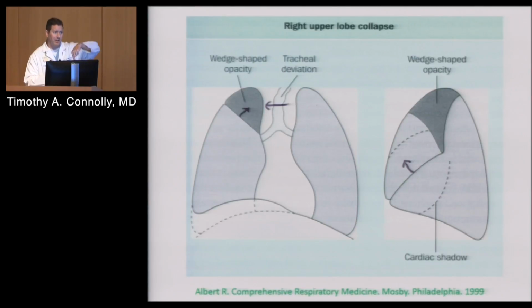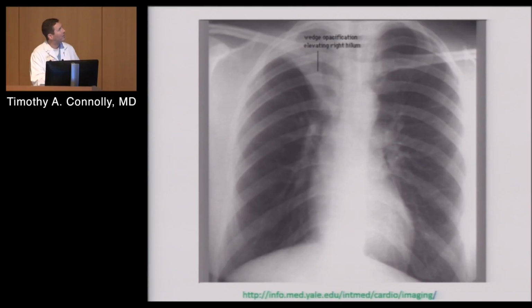That's not going to be the case when they have an endotracheal tube sitting in place. But those are little clues. So if you were looking at this and you saw white up here, you saw the trachea coming towards you, the diaphragm was higher, even though theoretically that could be a pleural effusion that's loculated up top, unlikely. It's much more consistent with an atelectasis picture. So here's an example of what it looks like in real life. So again, you have that clear loss of aerated lung tissue, and the diaphragm is higher on this side pretty substantially compared to the other side.